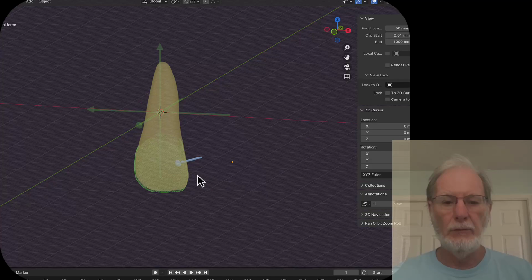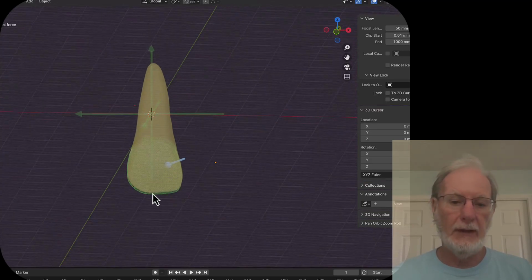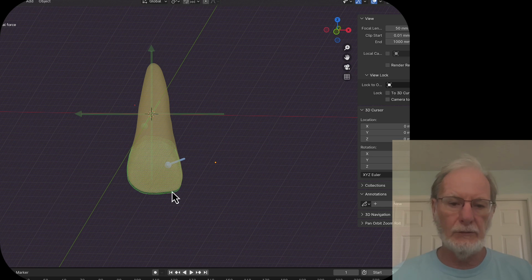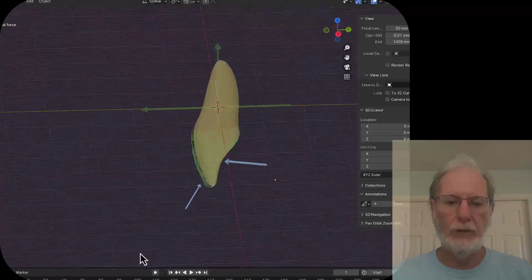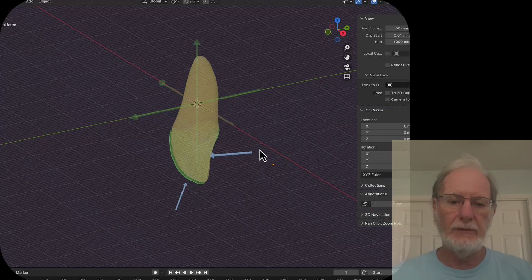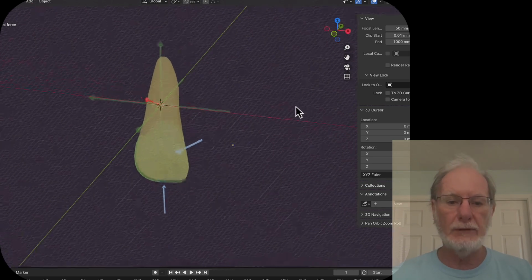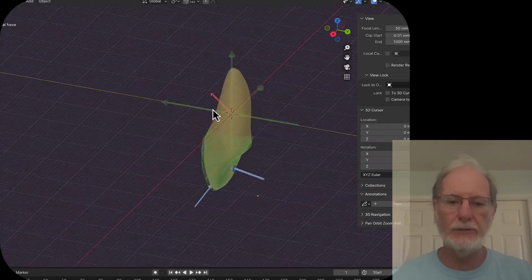So now we have this force and we say, well, I also want to introduce a bit of vertical control with the aligner. So I'm going to push on the aligner and I'll add a vertical aspect. So what you will have is a resultant. This force will come here and this force will come here at a 0, 0, 0, which means that you will have a resultant force roughly in this direction. Again, in 3D, it's much nicer to see.